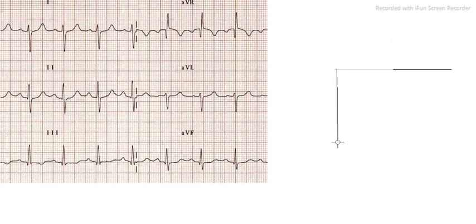Here you have your AVF. So let me level them up. This is lead 1, and this is lead AVF. Now you look at lead 1. So here it is our lead 1, and in lead 1 you look at the QRS complex.